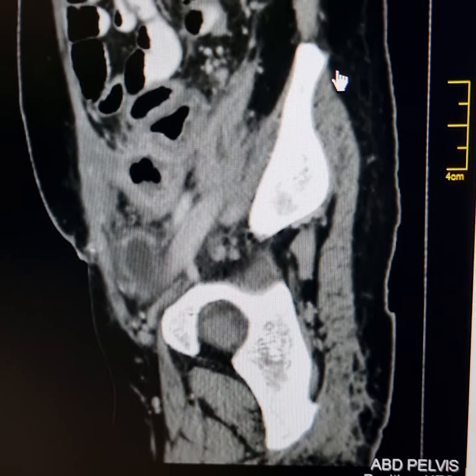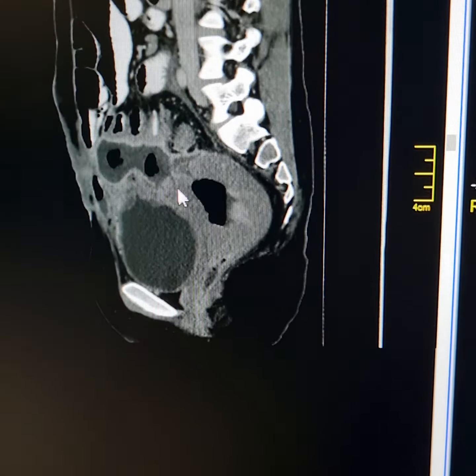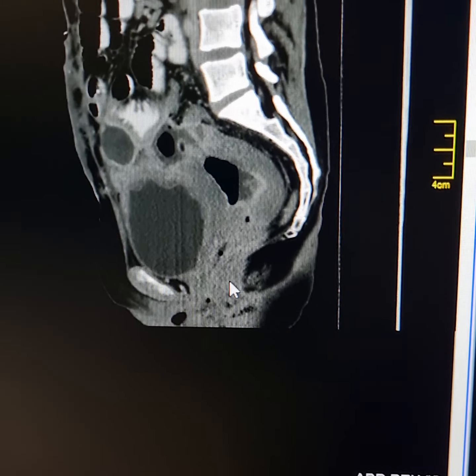Now this is the residual part of the uterus. Now this is communicating with the uterine cavity through this small opening here. This one is the site of communication between this abscess and, through the fundus of residual uterus, the uterine cavity. This is the air-fluid level in the posterior dependent part. So pus is coming from this abscess down into the residual uterine cavity, and then downwards, this is the communication with the streak-like vagina, this one. Air lucencies are present inside it.